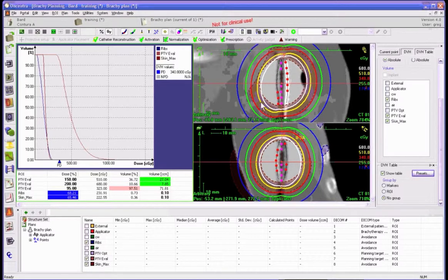But also pay attention to the 150 and 200% isodose lines here, and we'll see how much volume we really have there. We've already calculated it from the DVH directly, but this will tell us where we're making those compromises. And this is typical. If we're modulating in the area along the side of the balloon to reduce the dose, we will get a little excess dose along the ends in order for our volume parameters to come back where we need them to be.